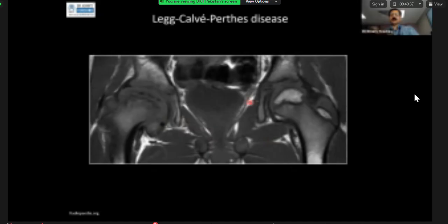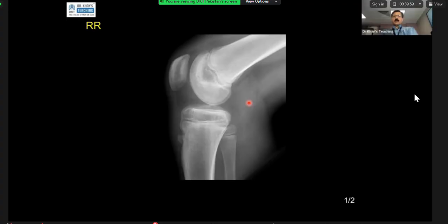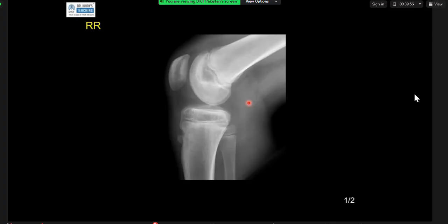Candidate 5: Yes, sir. So, spot diagnosis, rapid reporting, normal, abnormal. Abnormal, sir. And what is the abnormality? So the tibial tuberosity looks a bit avulsed. Can that be a normal variant? Yes, that can be a normal variant also.